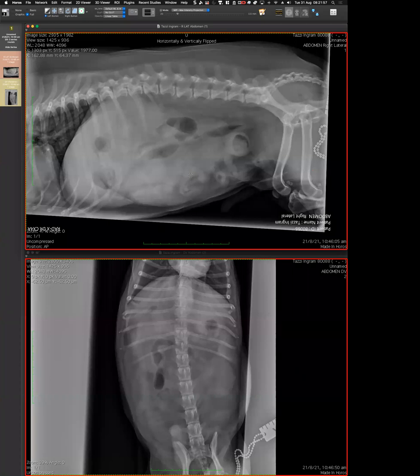Yeah, I agreed with Bron when she pointed it out. I thought, gosh, what is that? Is that an end-on transverse intestine that we're looking at? And does it have, say, foreign material in it? So Jack Russells tend to eat things that they shouldn't, although it's an older one.